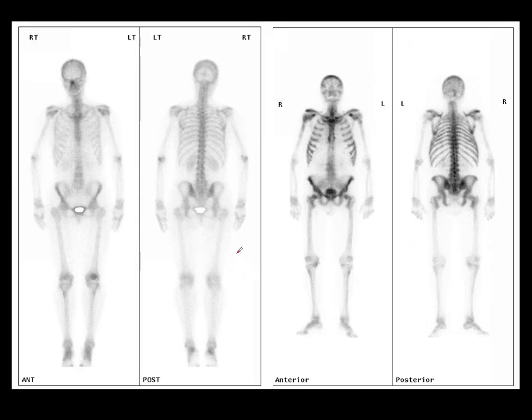Quickly, just to show you a normal one, this is the very first bone scintigram we saw in our first talk, and just to put that next to what I consider to be a reasonably subtle superscan.